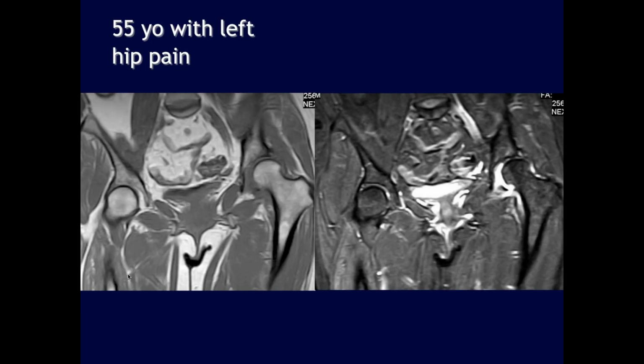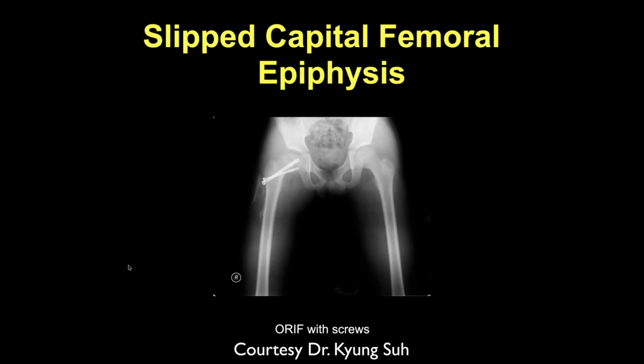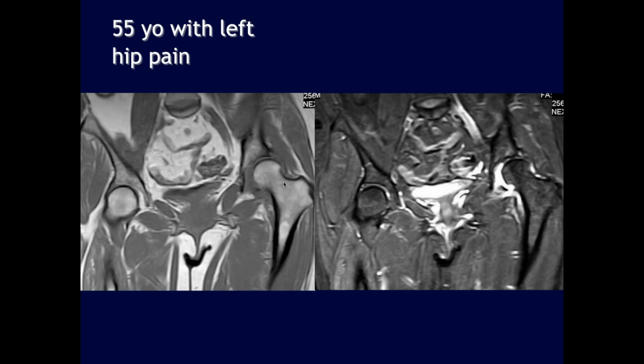You don't want to bend the hip in that fashion. If you notice how the pins are placed, that's not exactly what you want to do. Yeah, I'm not even sure this one's in the bone there. I think it missed the. We don't know. You have to put it in a frog leg. Yeah. But even there, the epiphysis is up here. If anything, it's just at the margin, but I'm not sure that second one is even in the epiphysis.